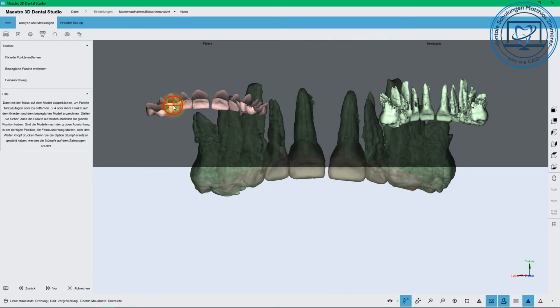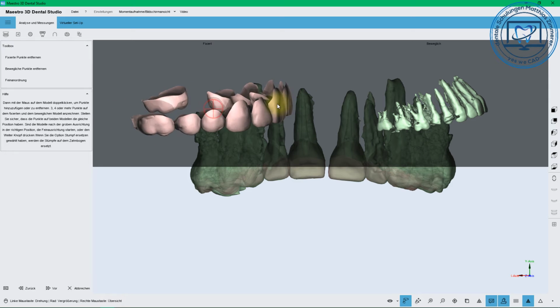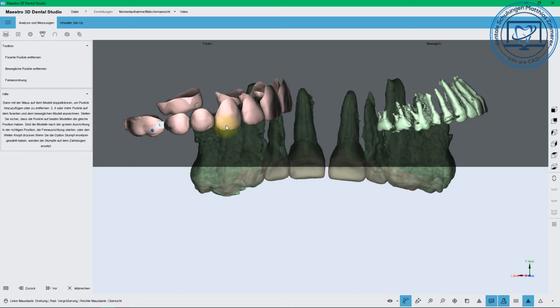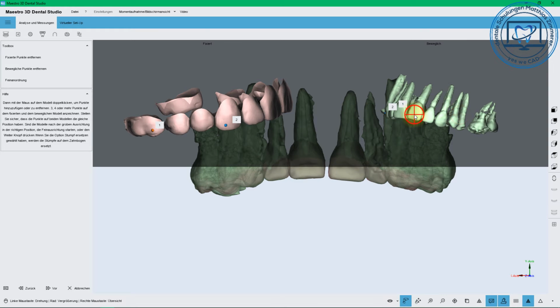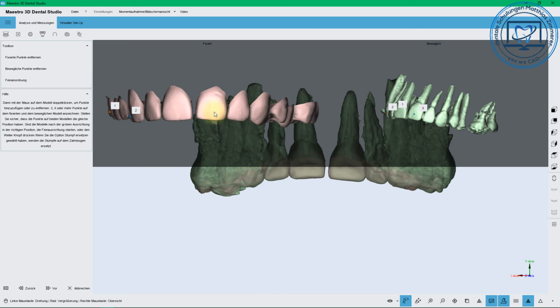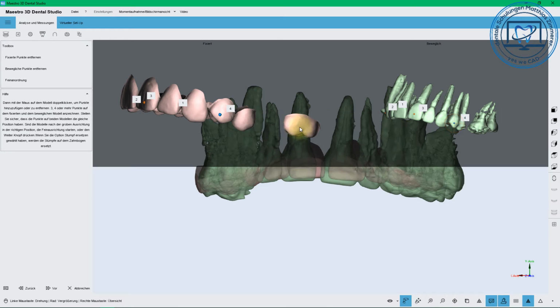You can import it from CBCT data, and this is extracted. You can use some software like InVesalius or make it out of the CBCT data software. But you see, it's always a little bit tricky between bone and the root data, because it's not so clear, and if the roots are not the best, then you won't get the best results. It's a multiple point matching, yes.